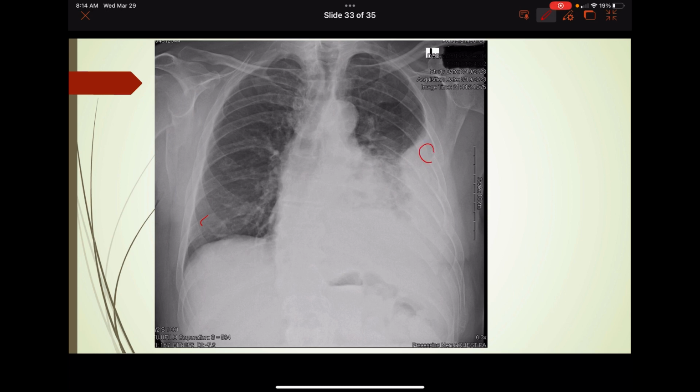So you can see a fracture here, fracture there, fracture there, fracture there, fracture there. So 1, 2, 3, 4, 5 rib fractures there. Looks like 1, 2, 3, 4, starting with the 5th rib, 5th through 9th. So this is blood in here. And he obviously needed a chest tube and got shipped out.